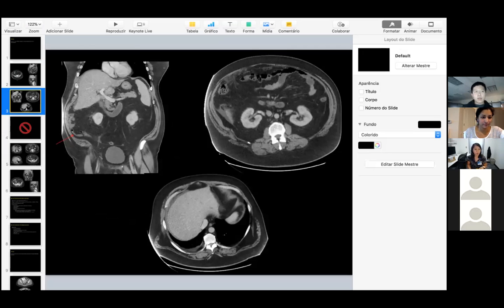So this I'm just showing you that the appendix is normal, so it's nothing to do with the appendix. Any observations on these two axial images for the rest of the study? Peritoneal spread. Yeah, so there's peritoneal haziness, most evident anteriorly here. And then the liver wasn't called, but it's quite subtle, and I'll show you a follow-up scan. So you have these little hypoattenuating areas. And so this certainly, the peritoneal observation raised some concern that this wasn't just a Meckel's diverticulitis or Meckel's diverticulum even.